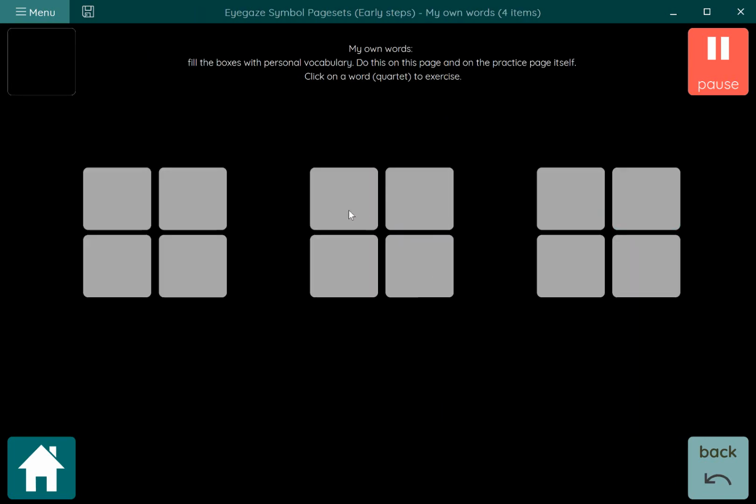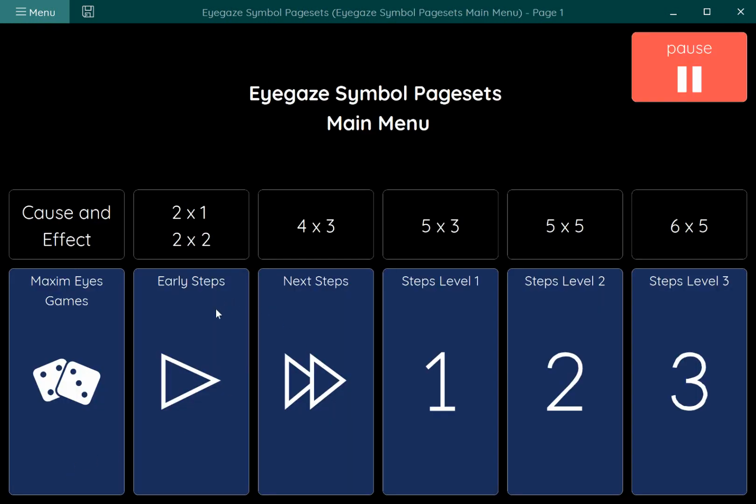Where you might use this, and I've done this before in previous versions of our software, you're called into a demo for a patient with a traumatic brain injury. The speech therapist is not really sure what might be appropriate for them or what they can even access. So you find out the patient's name, their hobbies, what type of pet they have, and you go in and customize 4 highly relevant buttons, and you do a simple activity to see are they answering correctly. So this library of pages allow us to have this template to do that.